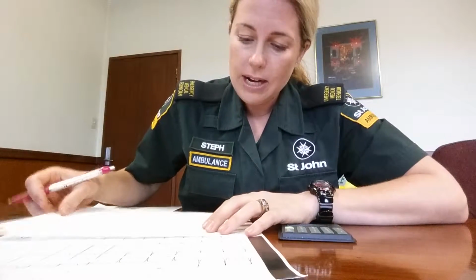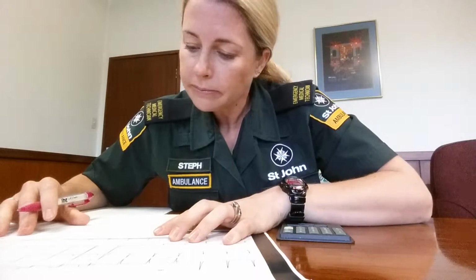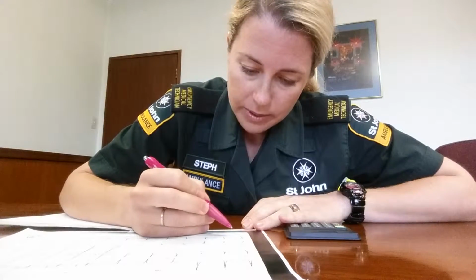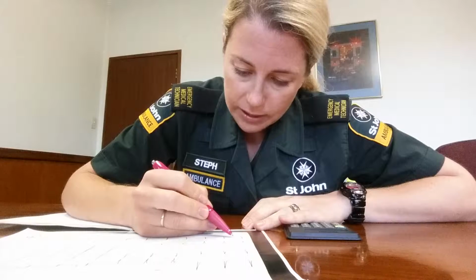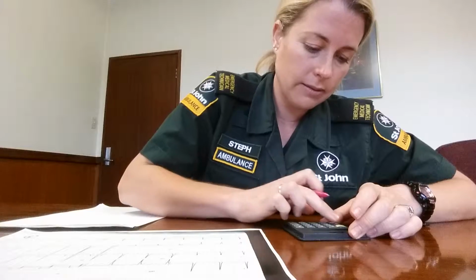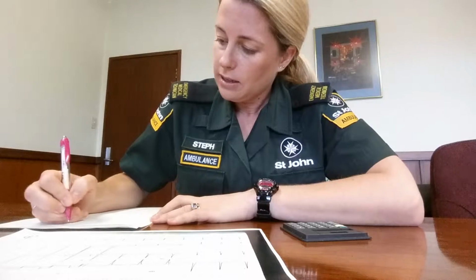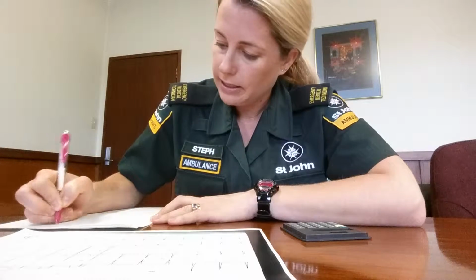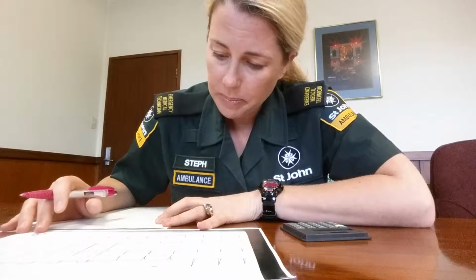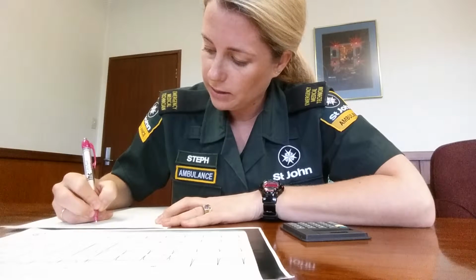I'll go ahead and check the rate and see if it is regular, which it is. So then I can use the 1500 method. Count the squares in between two R waves, which is 5, 10, 15, 20, 21. So 1500 divided by 21 is 71 beats per minute. And I'm looking for my P waves now. I've got P waves, one for every QRS. Normal complex, so I've got normal sinus rhythm.